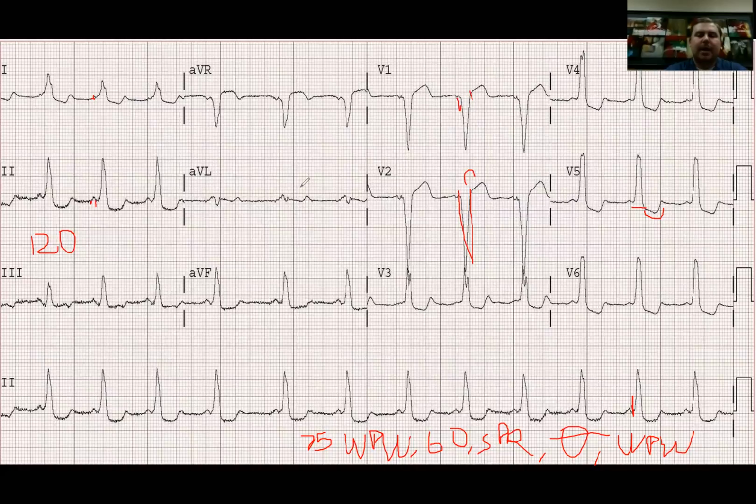They might feel some palpitations occasionally, but this isn't a tachycardia, so they're probably just sitting there hanging out. So if this happened out in the region and somebody identified this as ST elevation that they think is from STEMI, they could get a thrombolytic and end up dying from a bleed due to that thrombolytic, if only somebody would have caught that this was Wolff Parkinson White.